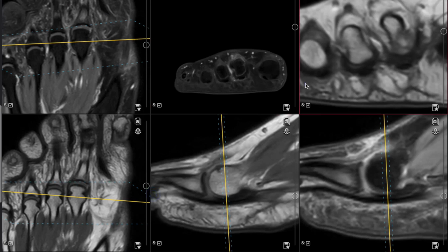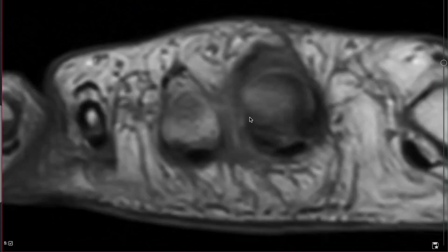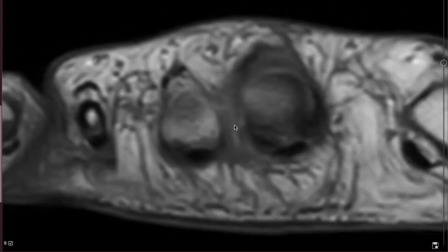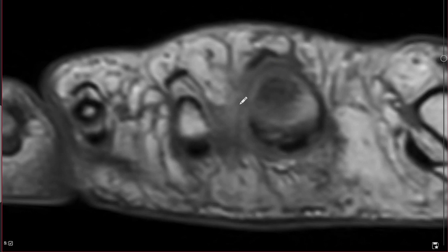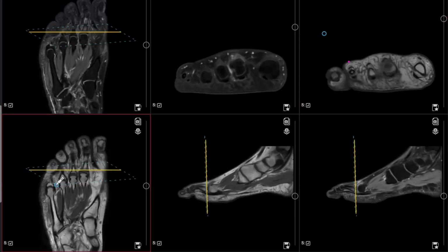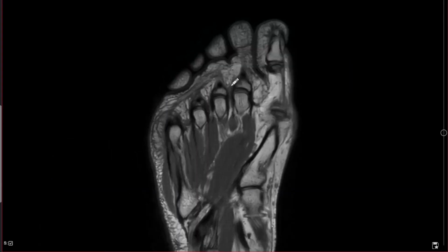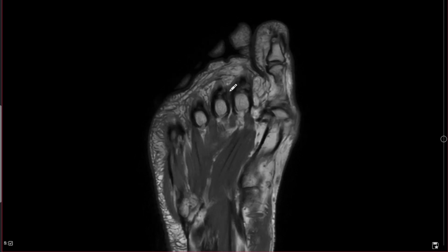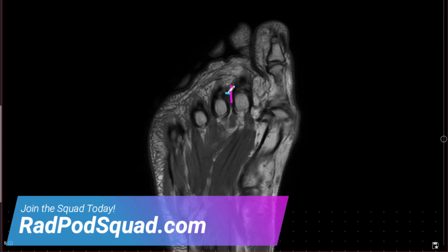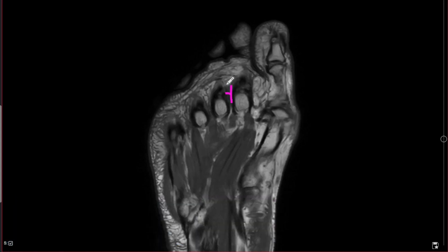and we can use our transaxial T2 or even T1 weighted images to get a sense of the neuroma that would live here, which you can see here, this Y-shaped structure that is measuring from here to here and from here to here. This is your neuroma. And again, we can even see that in the coronal plane where we can appreciate neuromas quite nicely on T1 weighted images, where we can appreciate the enlargement of the interdigital nerve seen here and the length of the interdigital nerve seen here. And we'd measure that. And if it's greater than 3 millimeters, that would be considered a functional neuroma.